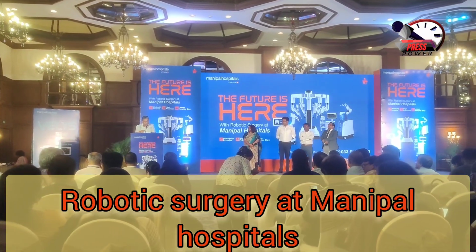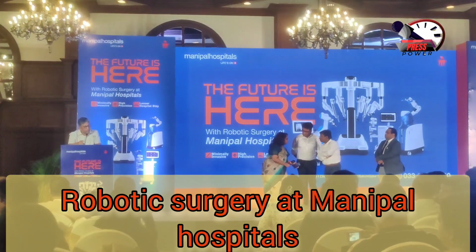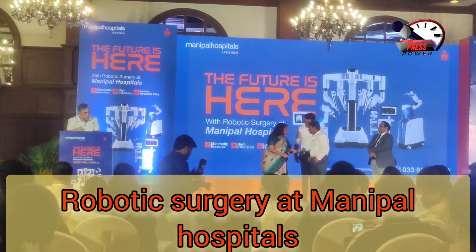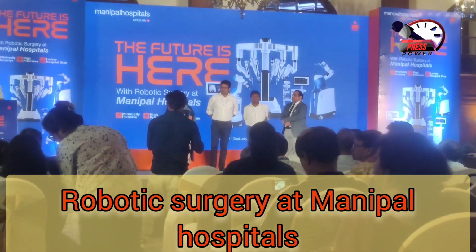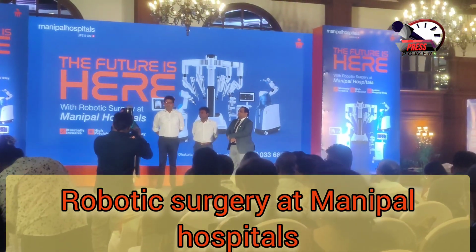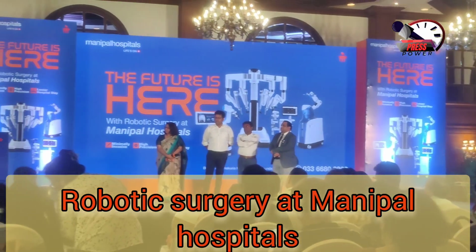They have laparoscopic scan. And the way I see it, all hospitals will have at least one, maybe more robotic stacks in their hospital. The more we use it, the more cost effective it will be. The cost will come down as well. So we are very hopeful to start our robotic program.